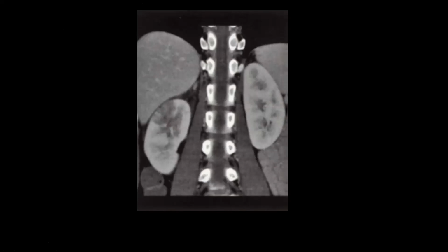Usually in patients with urinary tract infection, imaging is not recommended for all patients, only patients who have refractory or non-responsive disease, or patients with very severe symptoms or suspected upper urinary tract infection sometimes can benefit from imaging. Patients with recurrent urinary tract infections also may benefit from imaging. So this is a patient who had very severe symptoms and was unresponsive to medication.